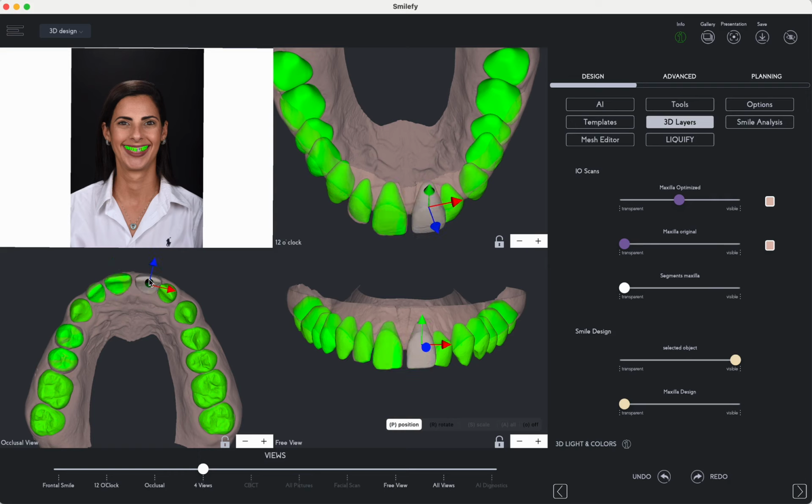distally. That's also a big concern about this central, which we will also correct here better, and this lateral bringing to the space, correct rotation, and canine, premolar, and position. Rotation.